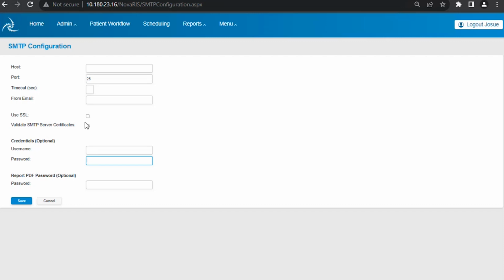We added in these latest updates this option that you can use third-party email applications. So that is one thing that we were a little limited before, that we will be able to work with hospitals that have their own email servers. However, now we can support customers that also want to use Gmail, for example, or even iCloud or any other type of third-party email servers that they can use. Now we can use that option.